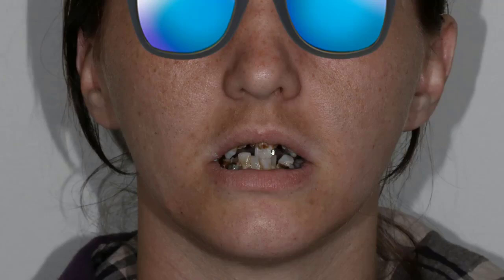Now, let's say you look at this patient and it's a 70-year-old man, and maybe they've got their lips apart, but you can't see any incisors at rest. Okay, well, clearly you need to add some, but how much? You can't tell that from the picture if it's not showing. So the only change I would make on this picture, if they don't show anything at rest, is either you or your assistant slide a perio probe under that lip and take the tip right to the incisal edge. Now you have something to gauge a measurement, so that if they're not showing anything, you would know how much needs to be added to get it dead even with their lip.